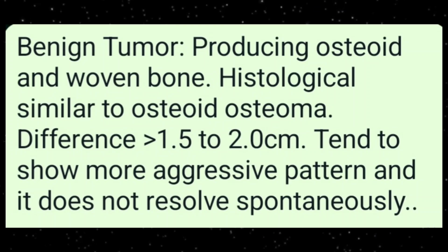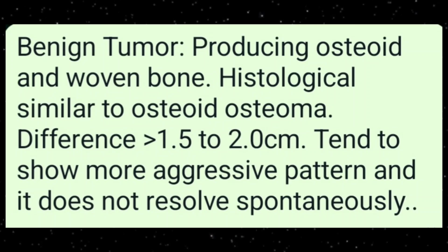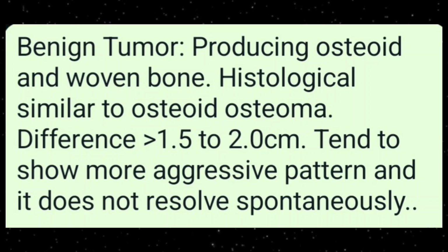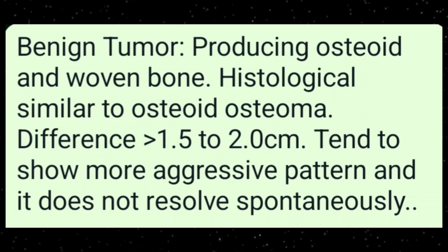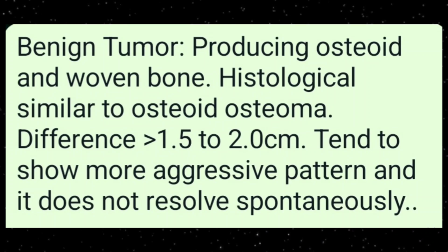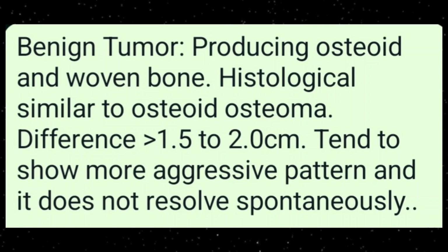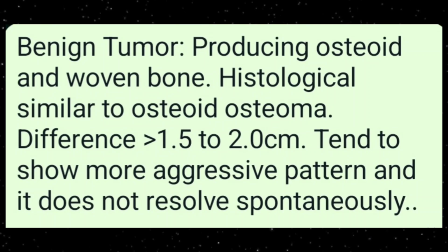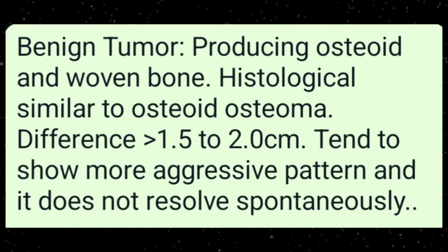It tends to show a more aggressive pattern and does not resolve spontaneously. So far as osteoid osteoma is concerned, it is less aggressive compared to osteoblastoma, and the second thing is osteoid osteoma resolves spontaneously. Osteoblastoma does not resolve spontaneously and has a much more aggressive pattern. So the radiological characteristics of both tumors are the same. The only difference depends upon the size.